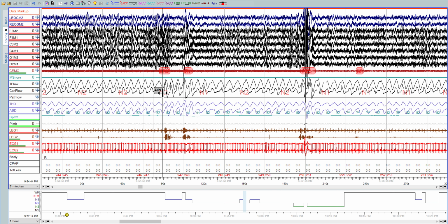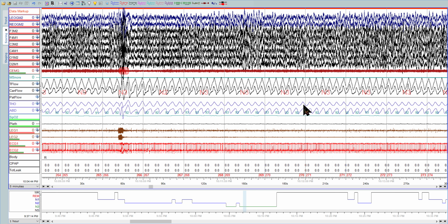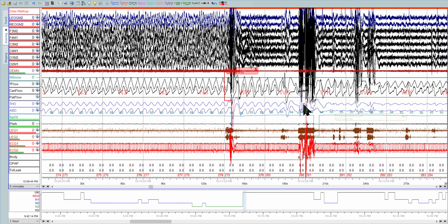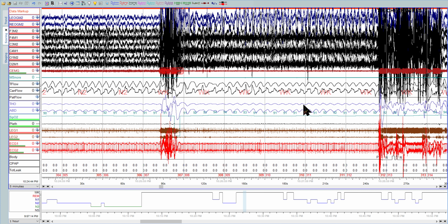Yeah, and that's just one breath there. It's good you didn't mark that. So far, so good on the scoring. Nothing really going on. It looked like most of this person's apneas were REM related, so I think you're so far doing good on your scoring.